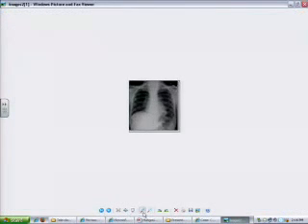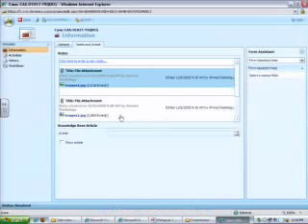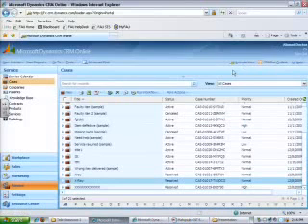I attach this to the case. He can see and examine right away. What's that? It's an X-ray, a chest X-ray. All these are attached to the case, and the case is related to that patient. It's going to stay stored in a database for future use for patient history, medical history. You can attach all these, and same thing for the lab.